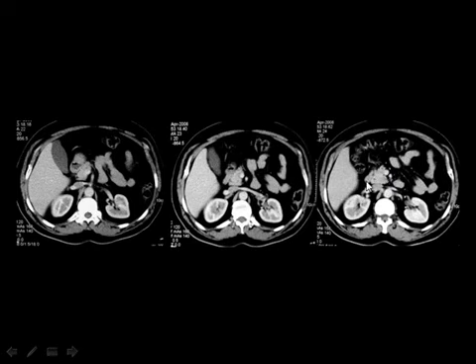And you can see part of the duodenum along the lateral aspect of the head, and if you look carefully, you can see a small hypodense structure here, which is the common bile duct. This is the common bile duct, and you can see it inside the pancreatic head. This is the superior mesenteric artery and superior mesenteric vein, bowel loops, liver, left kidney, right kidney, aorta, and IVC.